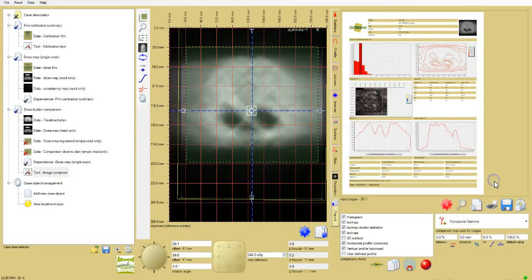If you have customized any of the charts for the report, you should have updated to specify that the customized settings are to be used. But in case you did not, click the icon at the far right under the section where the report pages are shown to do so now. And if you've made a change to any chart after specifying the contents and layout of the report, click the big red star to update the contents.